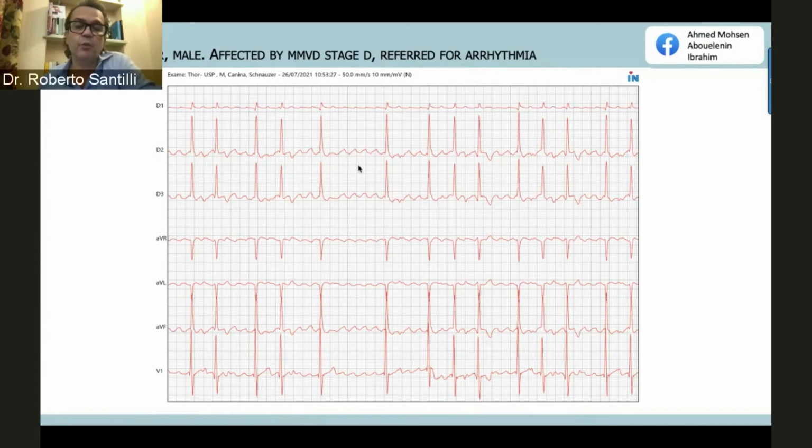But be careful, because sometimes when atrial fibrillation is paroxysmal, coarse atrial fibrillation can still look organized, just like this one. So remember, lead 2 is reading the interatrial septum. Lead aVL is reading the left atrium, and lead V1 is reading the right atrium.